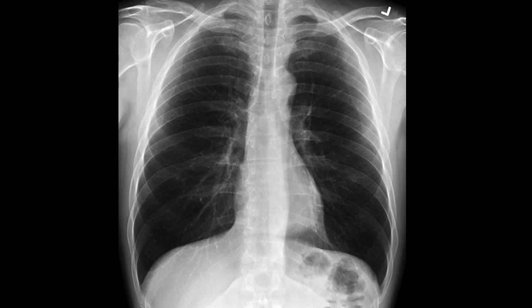So the commonest site at which a foreign body will get impacted is of course the laryngeal inlet, but if it somehow escapes that, expect the foreign body to be lodged in the right bronchus because of this peculiar straight and wider attachment of the right bronchus to the trachea.